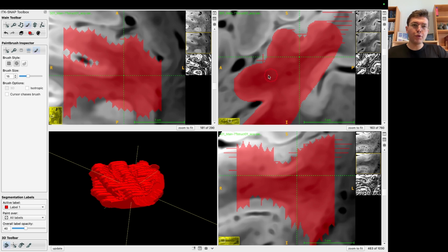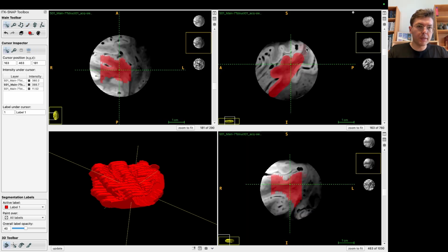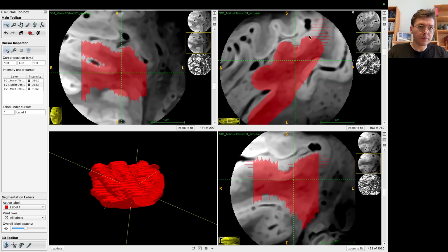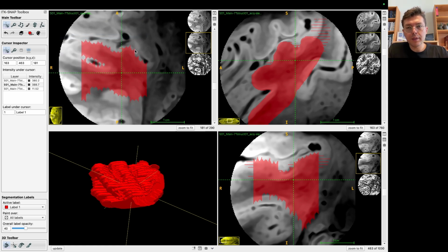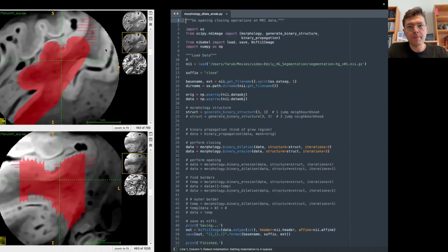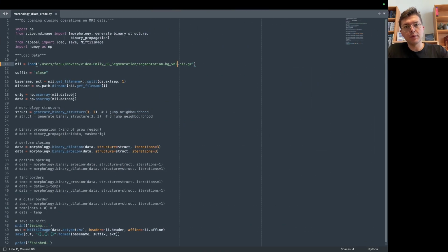Okay. The best view is this medial lateral direction to notice where the Heschl gyrus and so forth is. Okay, now I filled in a bit more. I'm going to save it and I'm going to use the same trick. Let's put version 2 here. And now we can do just 2 iterations.